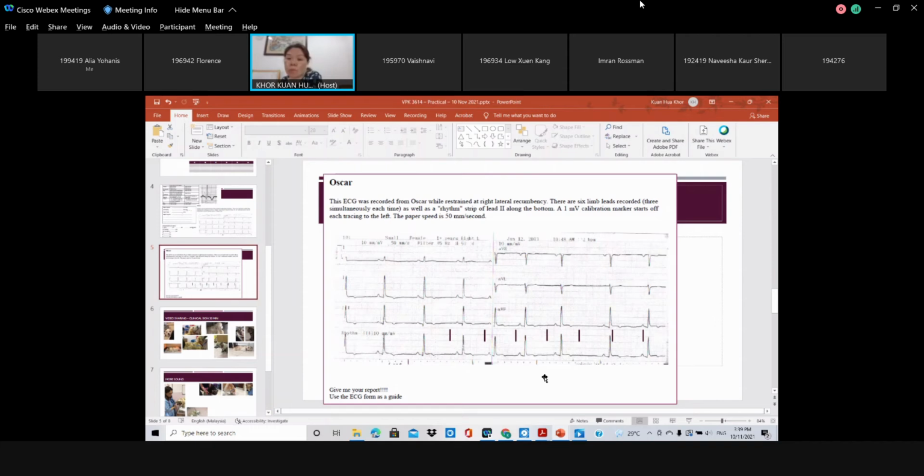Okay? Sometimes, depending on where your boxes are, let's say if I keluar this kind of soalan in your practical or your exam. Let's say if I move this thing around, kan? For example, if I start my boxes from here, how many complexes do I get? 6.